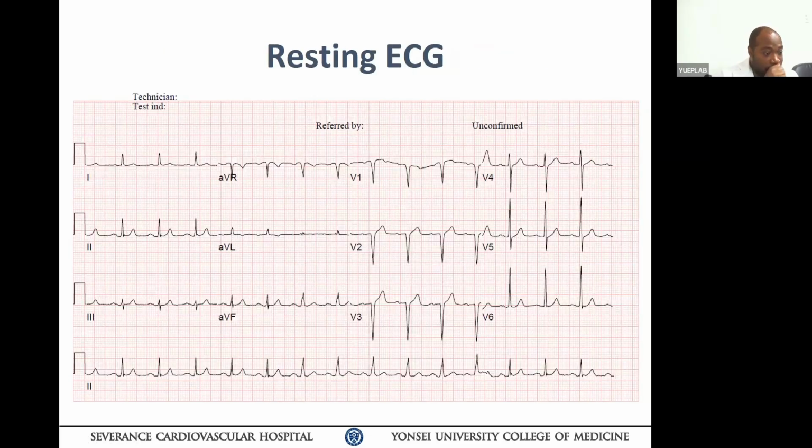This is his resting ECG after cessation of the tachycardia, and it essentially looks like a normal sinus ECG. However, looking at the marked area, I realize there's a change in the QRS duration. Here the QRS is much narrower for the first 5 or so beats. Then it broadens slightly without any significant change in the PR interval, for another 5 or 6 beats. And then it becomes narrow again like the baseline.